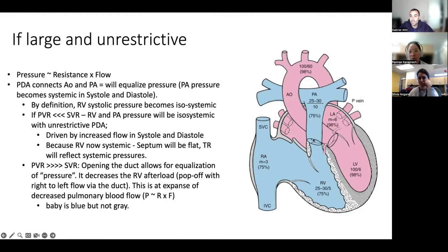If you have stenosis here, or let's say you have a massive interatrial shunt and you get a lot of blood flow coming back, you may have increased right atrial pressure, because it's a loading lesion. And that's true often when the kids are at a bigger age, not in the neonatal life. It's rare that we'll see these babies have high right atrial pressure right from the first few weeks or months of life, right? It's really an effect of chronicity, and that's why we say that interatrial shunts are often volume lesions.